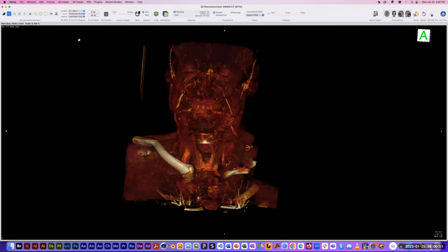For some reason, that data set literally has just those four images. So it's not enough images to actually reconstruct the volume. So try a different data set, maybe one of the Visible Human ones, because I know those are all fully 3D.